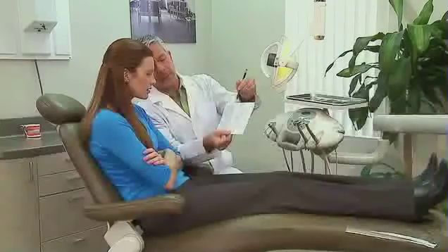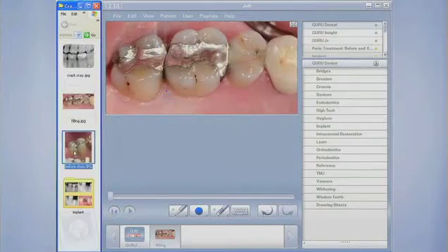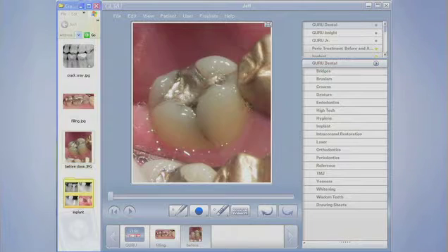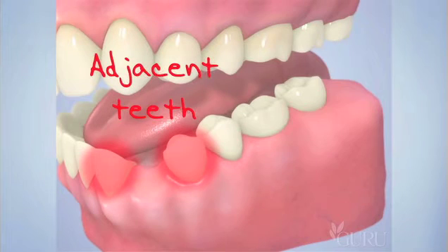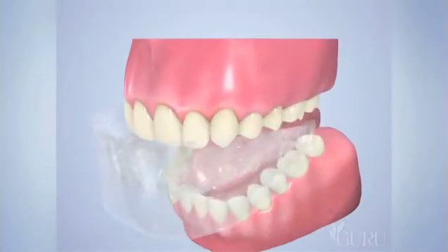So let's find out a little bit more about this program called Guru. Gone are the days of drawing on your bracket table cover and trying to explain things to patients. Gone are the days of taking a number 2 radiograph and trying to hold it up to the track light and draw a little inverted triangle and draw a circle with a very sharp pencil. Now we finally have the ability to put the patient's images, the graphic images, whatever you've got, into this program, and actually annotate them, draw on them, and do a voiceover with them and completely change the way you educate your patients.